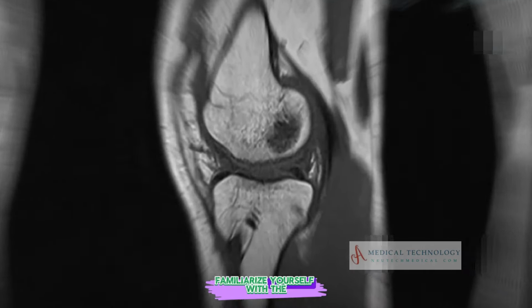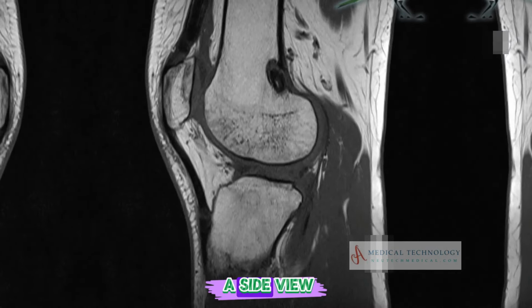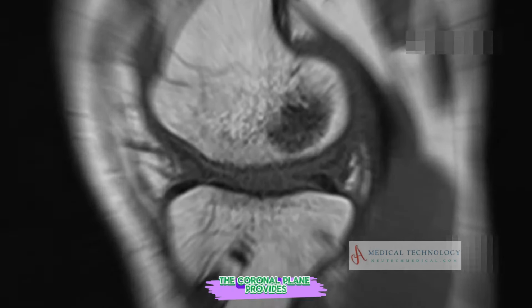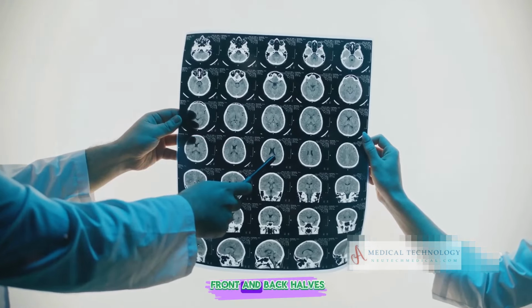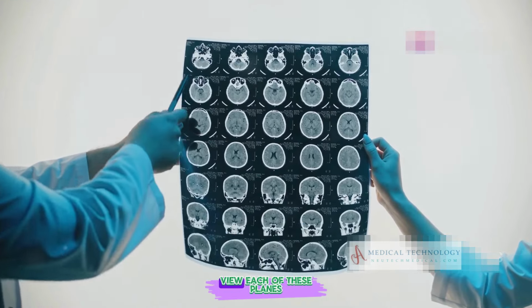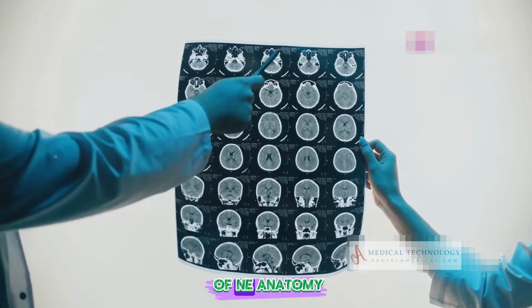Next, familiarize yourself with the MRI planes and sequences. The sagittal plane offers a side view, splitting the knee into left and right halves. The coronal plane provides a frontal view, dividing the knee into front and back halves. The axial plane, meanwhile, gives a top-down view. Each of these planes helps visualize different aspects of knee anatomy.